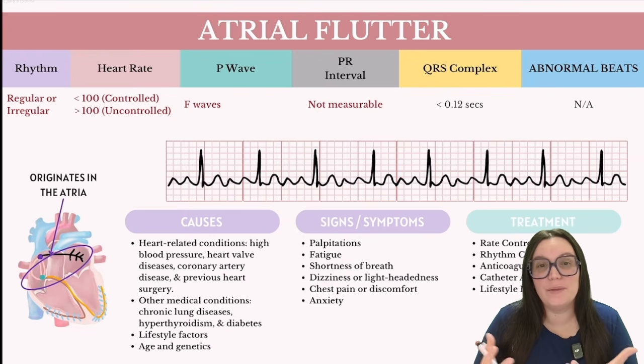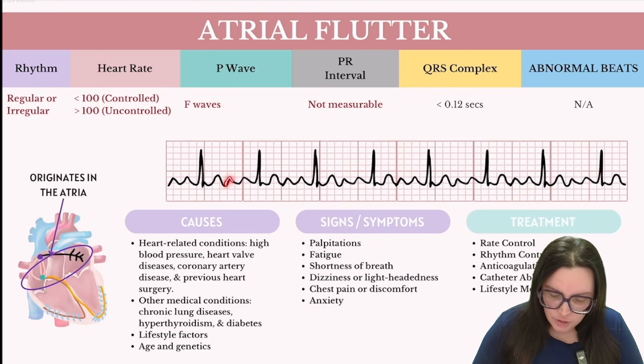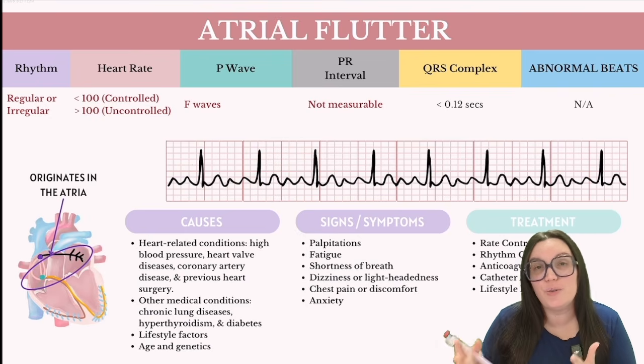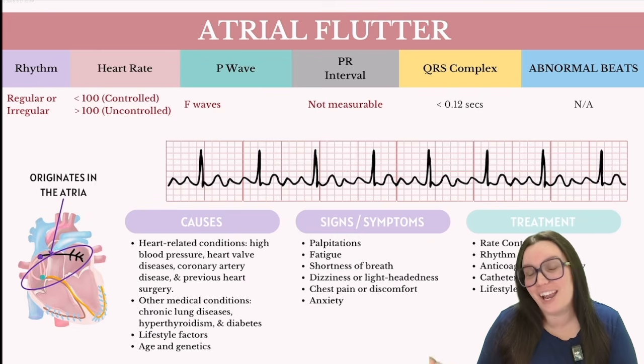The atrial rhythm in flutter is generally regular, and instead of the typical P waves that you would see on regular rhythms, there's actually going to be this distinct sawtooth pattern that you're going to see before the QRS complex. These are known as F waves. The atrioventricular conduction ratio can vary. Most commonly, you might see a 2-to-1 ratio, meaning that we have 2 atrial flutter waves occurring before each QRS complex, effectively halving our ventricular response rate compared to that of our atrial rate.